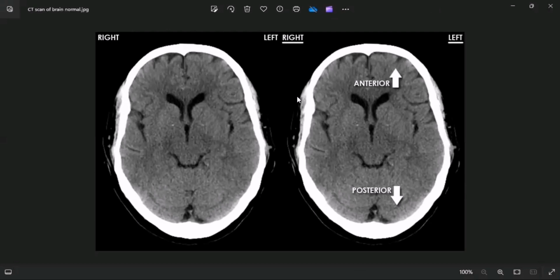So you can really picture, like you can really imagine what is happening around here. For example, what structure is this? You can tell me. What structure is this? The skull. Thank you very much. The skull. Now, I made a statement on the anatomy model. Why do you think the skull is white?